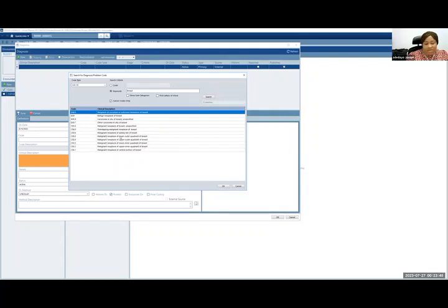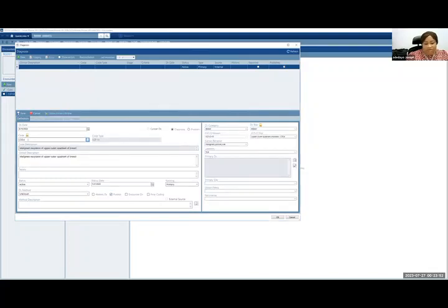So this woman has a malignant neoplasm in the upper outer quadrant of the breast. I choose this and click OK, and then it codes it for me. So the code is C50.4, and we're using ICD-10 here. And this is the code description: malignant neoplasm of the upper outer quadrant of the breast.